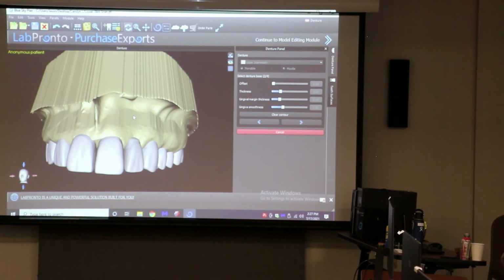And now you see how that brown went away? And now if you rotate it, you'll see a little brown up there. And that's the true undercuts that exist now from the path that you taught it. And then you've got to say, how much do I want to allow? Do I want to allow 0? If you want to allow 0, then just crank it all the way down. Because you want this thing just to slide on.